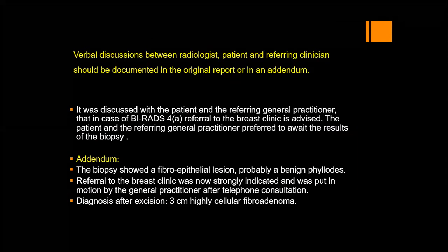This is an example. It was discussed with the patient and referring general practitioner that in case of BI-RADS 4A, referral to the breast clinic is advised. The patient and referring clinician, the general practitioner, prefer to wait for the result of the biopsy. Addendum: the biopsy showed a fibroepithelial lesion. Like what fibroepithelial lesions?